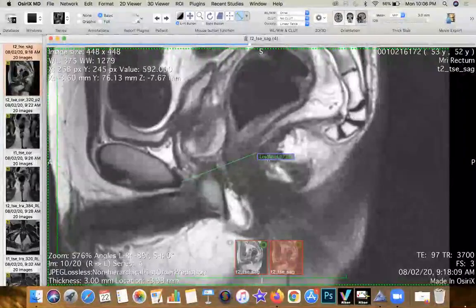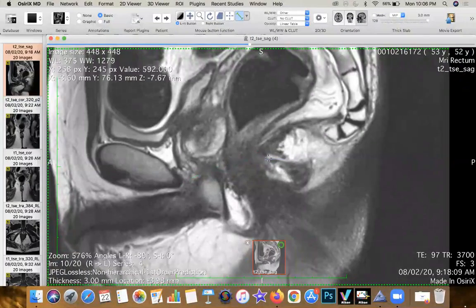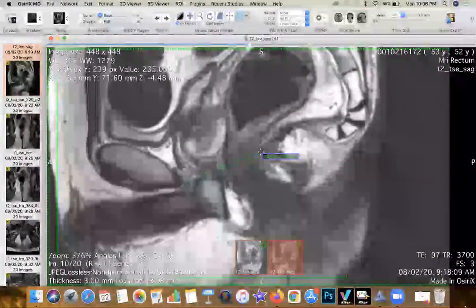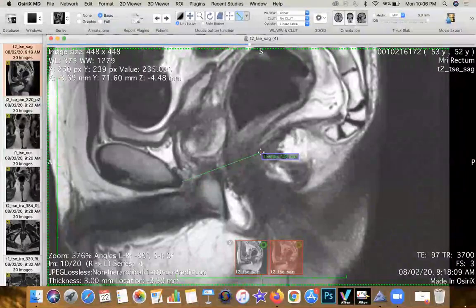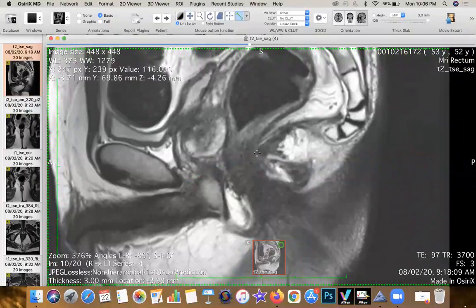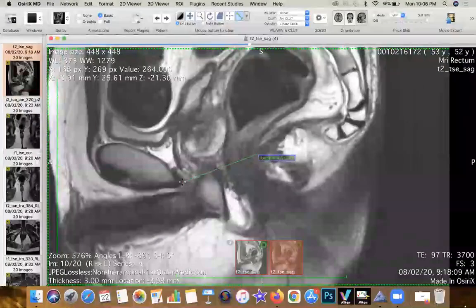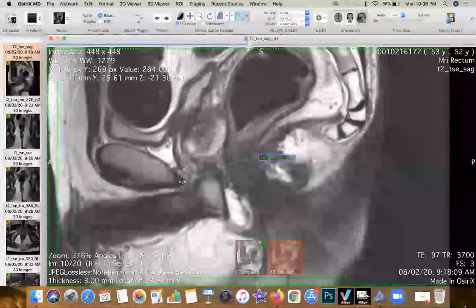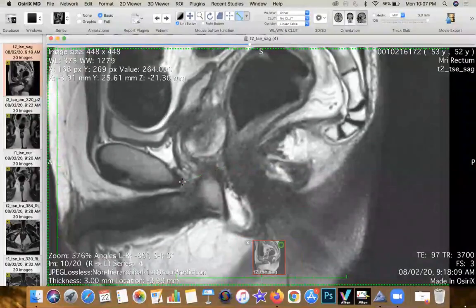So what does this line basically tell you? This line is what we call the pelvic hiatus. This is the hiatus or the opening through which the pelvic structures descend down into the perineum. So this hiatus should never be more than 5 centimeters in a neutral position. If the hiatus is widened, it usually means there's some form of laxity of the pelvic floor itself. So you've got the pubococcygeal line, you've got the H line. What do you have next?